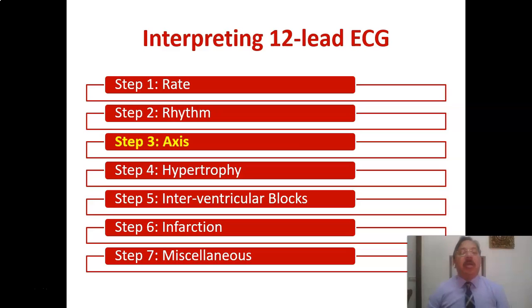All right. So we have finished step 2, which was about the rhythm analysis. Now we are moving towards step number 3, which is the axis determination.